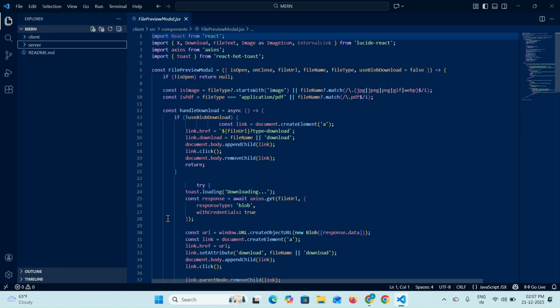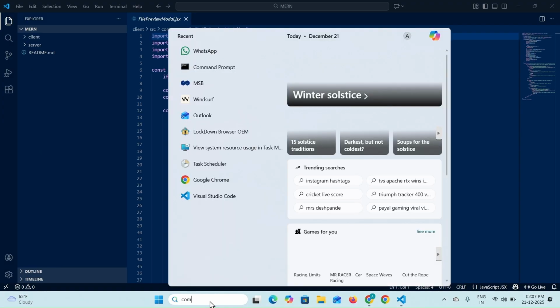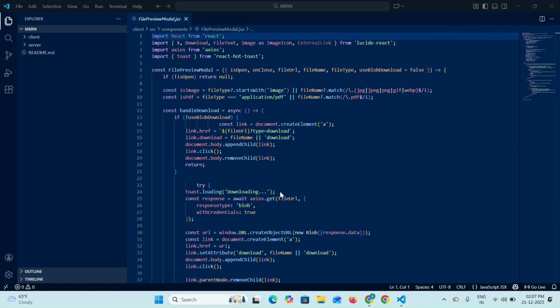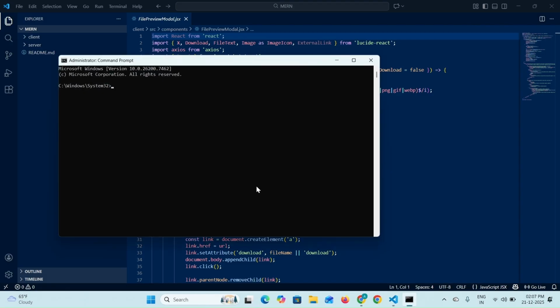The system is designed for patients, doctors, caregivers, and administrators, where each user has a separate role and dashboard. Patients can upload their medical reports and view live health updates. Doctors can monitor assigned patients and generate prescriptions. Caregivers can view health data with permissions, and admins manage the entire system securely.